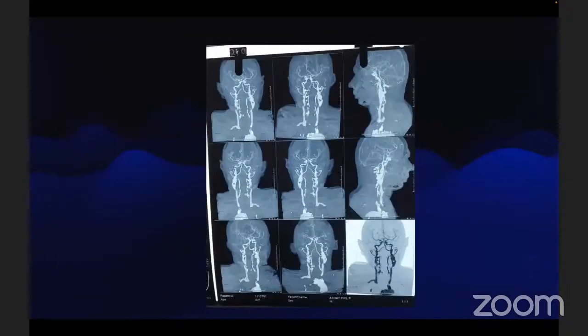With this, this is an angiography picture which was showing irregularity in the bilateral ICA along with a supraclinoid aneurysm, approximately in the choroidal region. The main purpose of presenting this case is that the patient has deranged or deformed arteries, bilateral ICA, from the origin of ICA to the intracranial ICA.